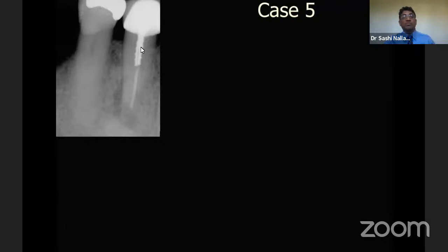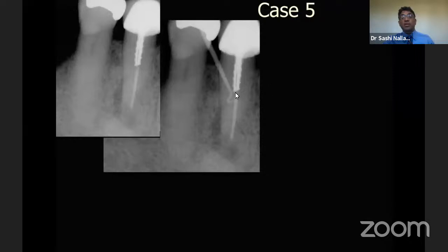Here is another example of it. A tooth that had a root canal treatment done, a mandibular premolar, has a large screw post in it. Now there is this kind of J-shaped lesion around it. And there is a sinus tract heading straight to where the post is ending. So here is the scenario. I'm looking at this and I'm thinking, maybe the root cracked at the base of the post.